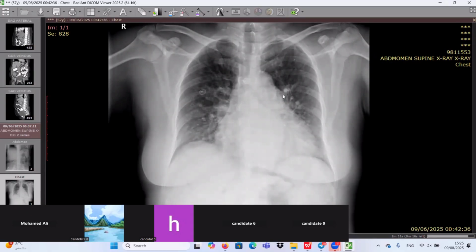Okay, I'm suspecting bilateral upper venous diversion. Okay. There is some cystic changes and bronchiectatic changes in the bilateral upper zones. Also, and peribronchial thickening. So I cannot see pneumothorax. Can you go by your checklist, please? Yeah, there is no consolidations.